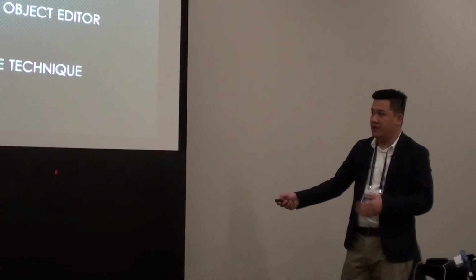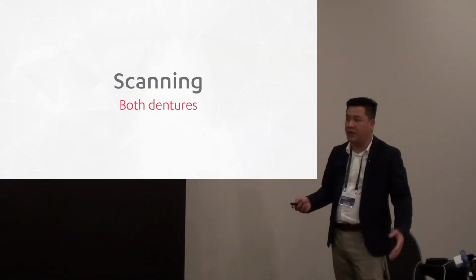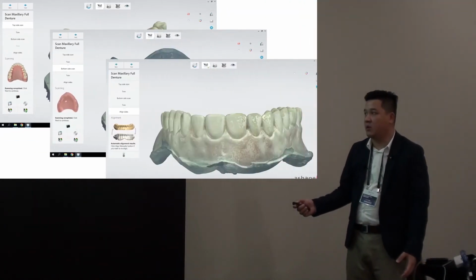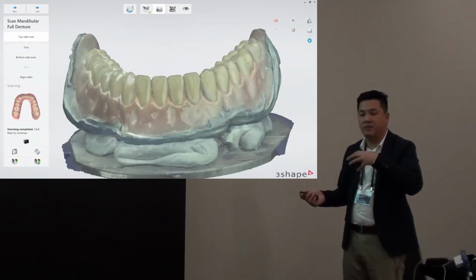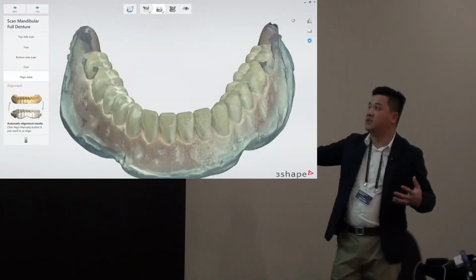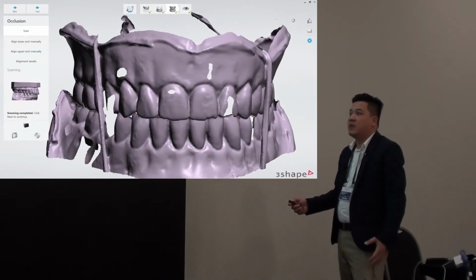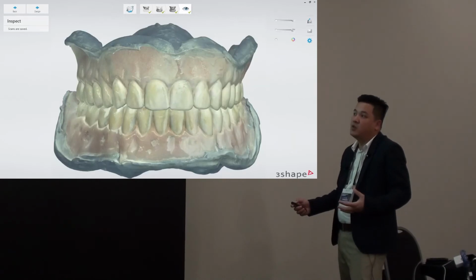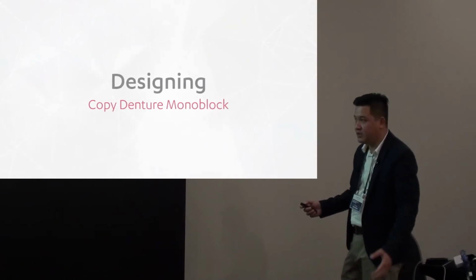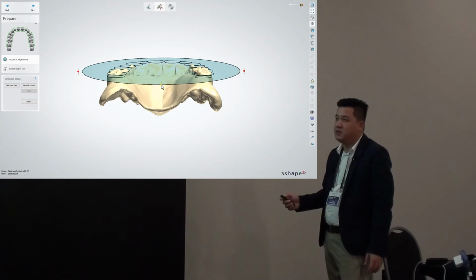So it's also a great method if you're doing reference dentures, doing like CBCT markers or fiduciary markers for implant-guided surgeries. So Copy Denture, as the name suggests, you're scanning it in, upper and lower side of the denture, and you're aligning it to make a nice solid object. So in my example, where the patient loves their existing denture, or maybe they need to do a little reline or a rebase or something like that, but they want new teeth, you could go into Copy Denture, you could take this and you could manually try to, again, carve chicken scratch, as I was saying, and designing it and trying to make it look somewhat presentable.